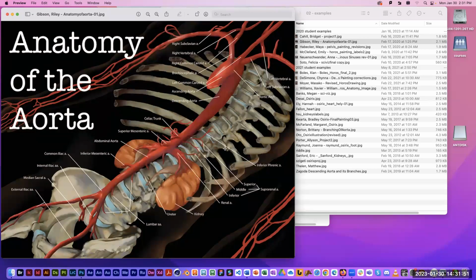Okay, I may have shown this one in a PowerPoint at one point. Another one focusing on arteries. Again, nice crisp vessels with nice sharp edges. No fuzzy soft vessels that blend in with their surroundings. The ribs look pretty sharp and crisp. Vertebrae look pretty good. So a very, very dramatic image.